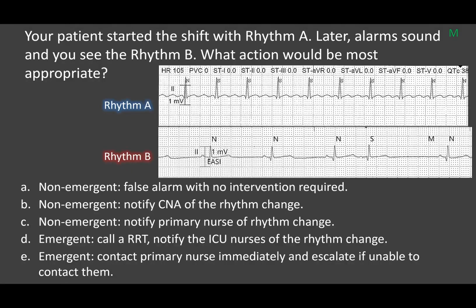Your patient started the shift with rhythm A. Later on, the alarm sounds and you see rhythm B. What action would be most appropriate? And so for monitor techs, what are we going to do? Well, does this appear to be a false alarm? Nope, not at all. Is this an emergent change? Well, you really have to figure out what your rhythm is. So I'll give you a second to look at it, pause if you want, but I'll go ahead and start saying it now.